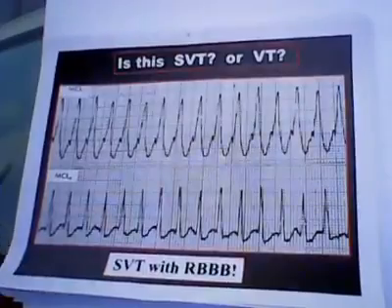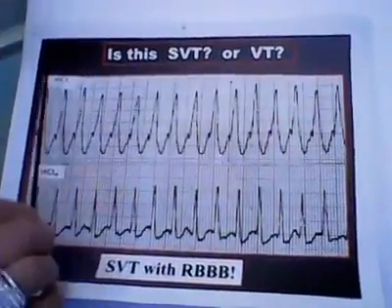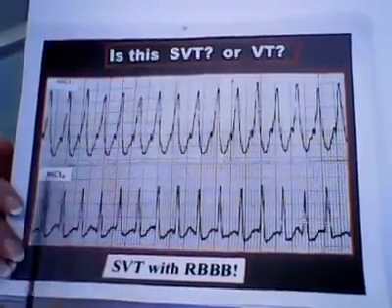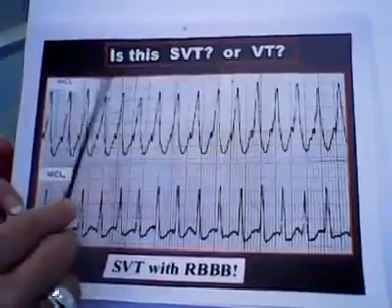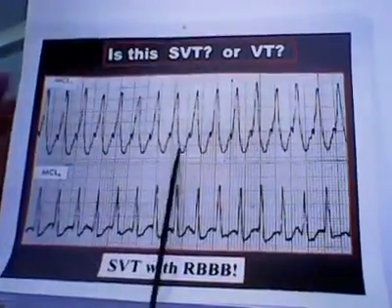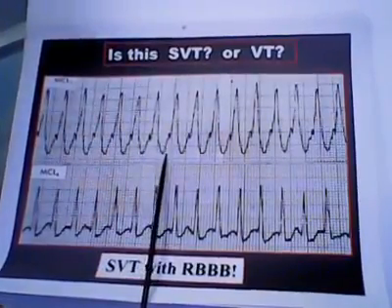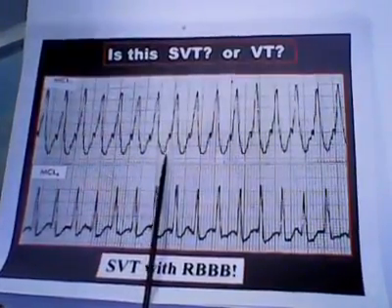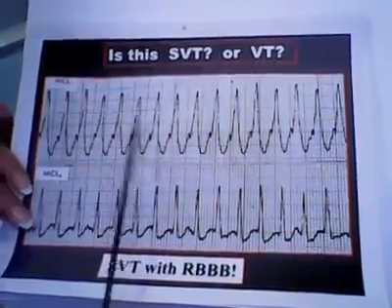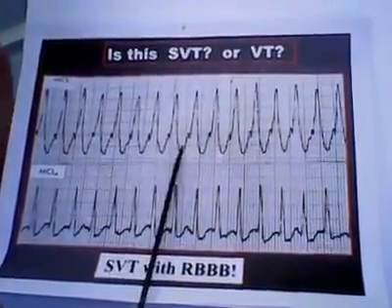Okay, here we go. We're looking at MCL1, right? Let me get this close to you here. We're looking at MCL1 or V1, right? And this is MCL6 or V6. And people say, you know, what is it? Is it VTAC? Now, most people, if EMS brought someone into the ER and you took a look at the monitor and you saw that they were doing this, most people would jump up and think it's an emergency. I mean, the guy is in SVT, but it's not VTAC.